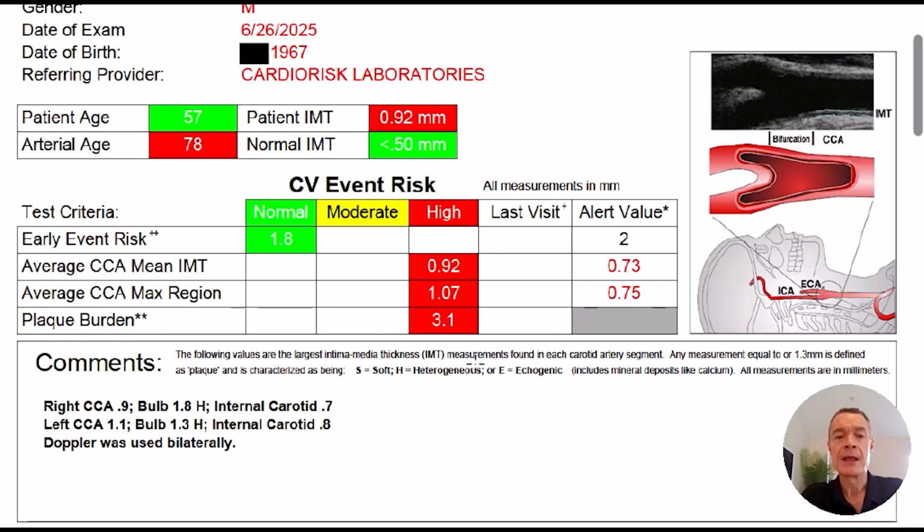Now, plaque burden here, you can see 3.1 millimeters. I explained in part 1 where that number comes from. The measurement noise factor there is greater. The standard deviation is 0.3 millimeters. And so you've got to be looking at greater than 2 standard deviations, so greater than 0.6 millimeters in this number before you could plausibly say, hey, that's physiological, biological change, okay?